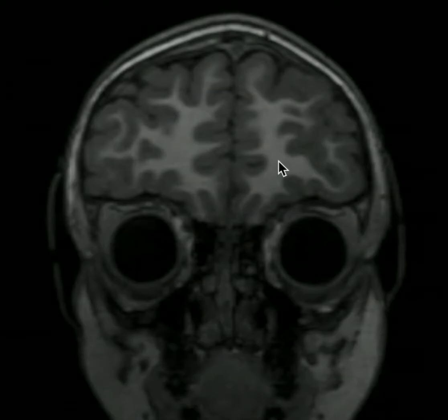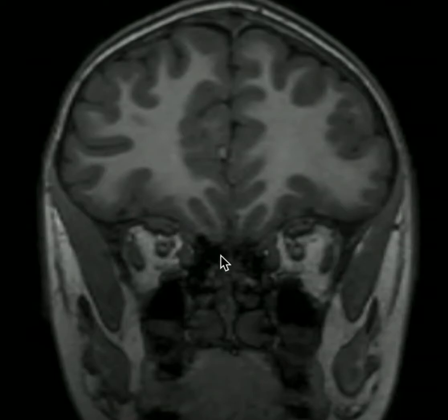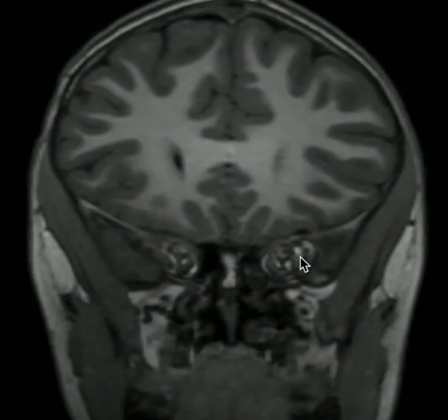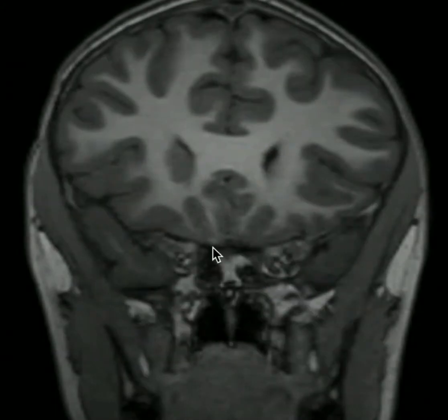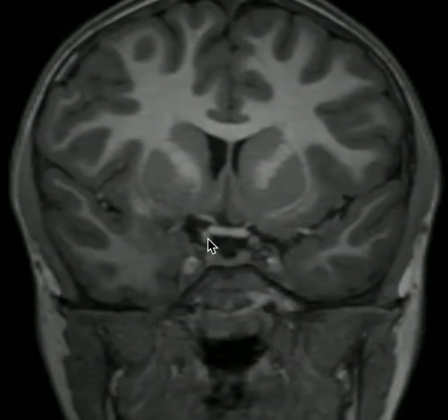I've switched over now to these thin section T1 weighted coronal images. We'll use these to identify our notable midline structures. We're starting here anteriorly at the level of our globes, and first I'll point out the optic nerves as they emerge from the globes, here and here. They will course posteromedially, so as I go posteriorly, we'll see them get closer and closer together. Here is our right optic nerve, and here is our left optic nerve. They will meet at the optic chiasm, seen right here.